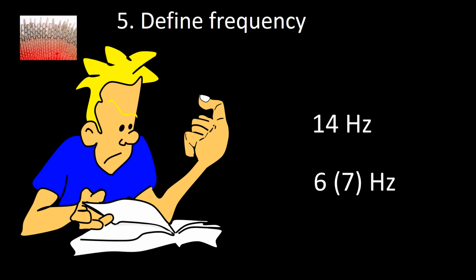The frequency of the spikes within the burst is 14 Hz or 6 Hz. Faster frequencies, that is those closer to 14, occur in older patients, whereas slower frequencies, that is those closest to 6 Hz, occur in younger patients. Nevertheless, bursts with both frequencies intermixed, or bursts that predominate in one but are also mixed with the other frequency, are recorded.